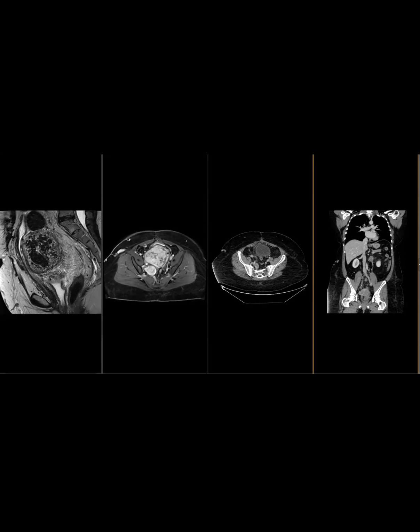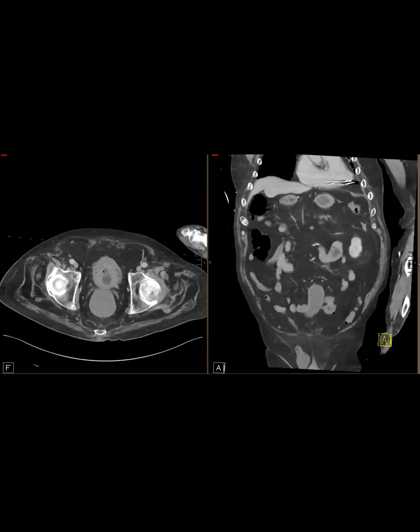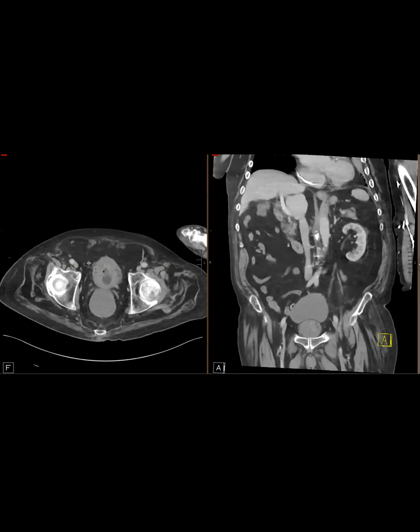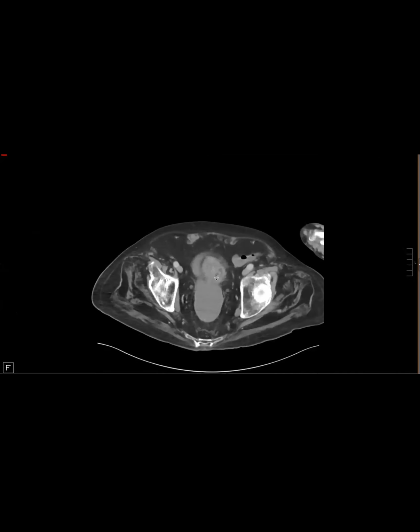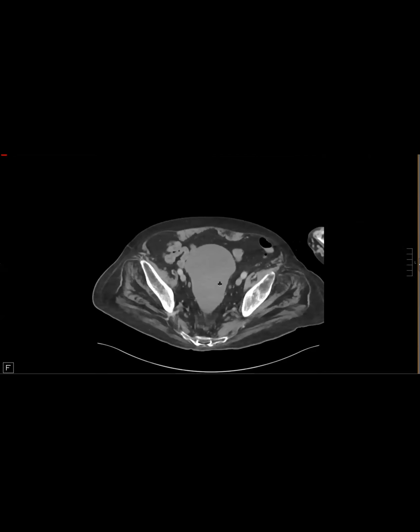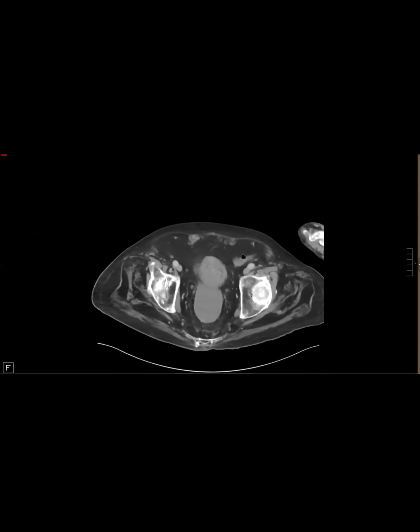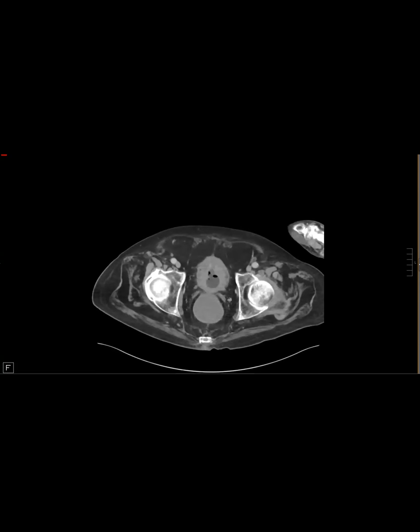The first one is a patient with a history of recurrent UTIs, and on imaging there are all these cystic spaces within the wall of the bladder. The patient had a positive UA, and clinically had evidence of recurrent UTI. So to me, I thought this was cystitis cystica.